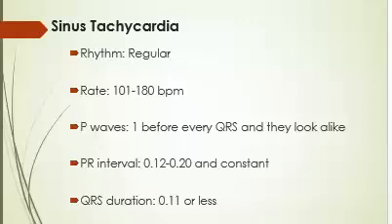We could have gone over rhythms for the rest of this week. So I wanted to let you know that the thing I want you to pay attention to with this one is, yes, it is still going to be regular. There is still going to be a P wave before every QRS, and it's going to look alike. The catch is that the P wave, because our heart rate is so fast, is starting to get closer and closer and closer to the T wave.